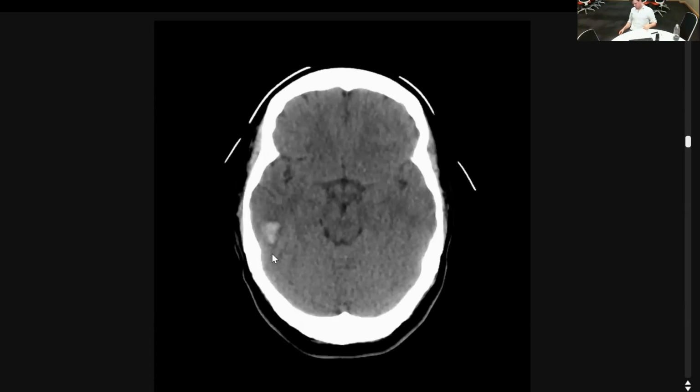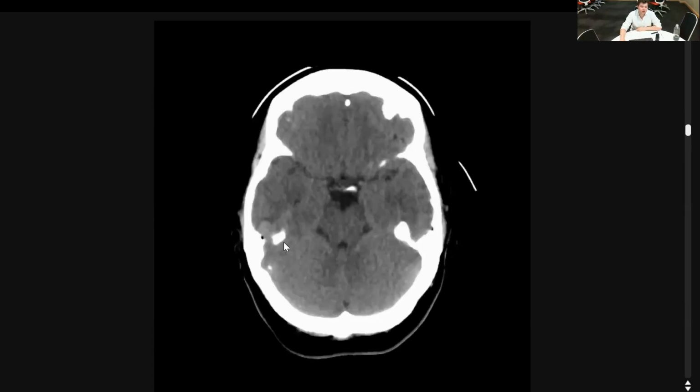Given the history, I don't know if it could be an extension of a subarachnoid, just purely because of the history, really. Headache and vomiting, you see what I mean? So you would do the blood windowing, have a look, see if there is anything in the subarachnoid space. This is just a parenchymal bleed.